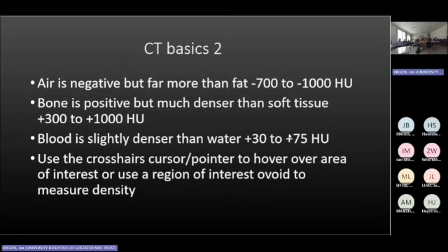But if we see a large vessel with content that is 30 or 40 Hounsfield units, it means that the patient very likely has anemia, and it should be 50 and more. We don't give you hematocrit values just based on CT, but we can tell you if they lost a lot of blood, unless they're given contrast.